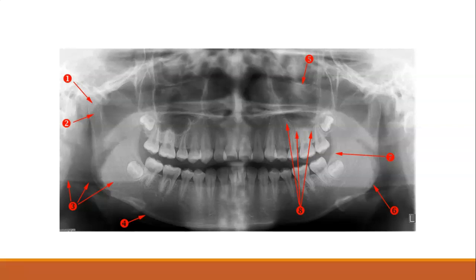Okay, so here's some I felt like I added in. They're kind of random, mixed in maxillary and mandibular. It's not categorized like the first set, but I really liked the clarity of these panos and the bright red arrows. They're not chunked up into nice categories, just whatever they thought popped out clearly on the pano. But I wanted to use these because it's just more studying.